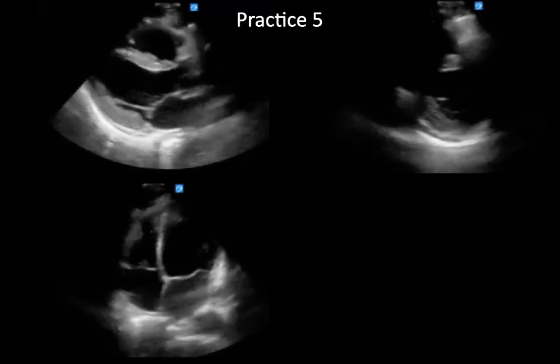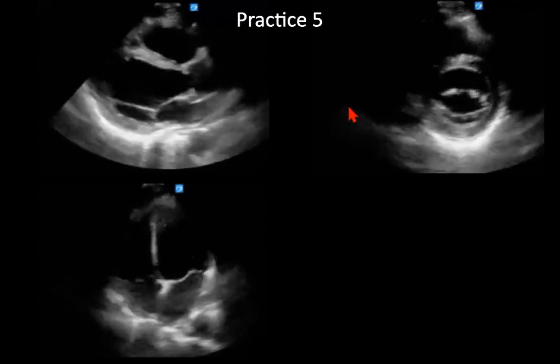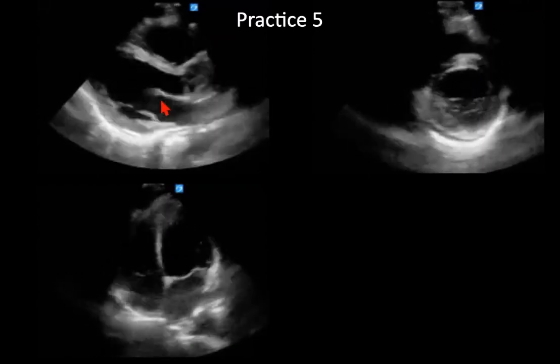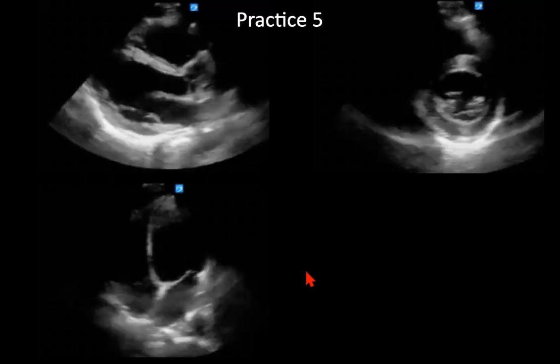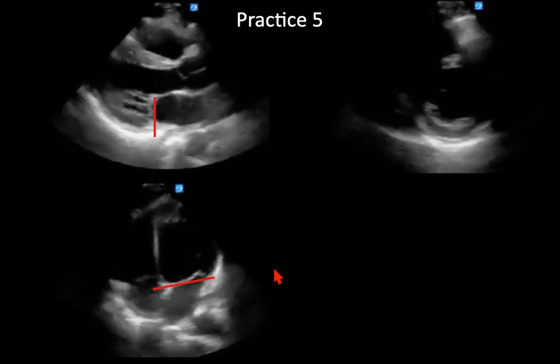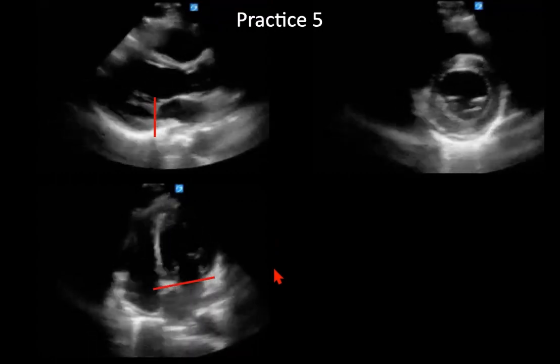Judging by the axial contraction, I think it's less than 30%. And then the mitral valve anterior leaflet goes about halfway the distance to the septum. And then let's take a look at the mitral annular excursion, which is reduced. I would say that this is moderately reduced contractility.